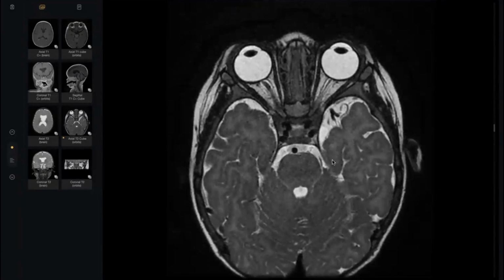Sir, I could appreciate mild atrophy of the left temporal lobe. I could appreciate a prominent vessel over here. Don't worry about it. Look here, doctor. Compare optic nerves right with left. Yes, sir, there is atrophy of the left optic nerve, and the right optic nerve seems fine.